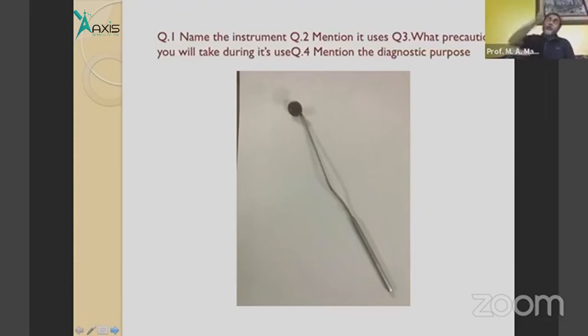In the roof, we can see the adenoid pad or adenoid. Laterally, we can see the opening of the eustachian tube, and more laterally, the tubal elevation, and more laterally, the fossa of Rosenmoller. So these are the parts we can see by this instrument: the posterior part of the septum, posterior part of the turbinates, posterior choana, opening of the eustachian tube, tubal elevation, and fossa of Rosenmoller.